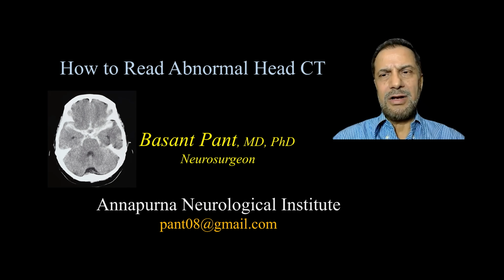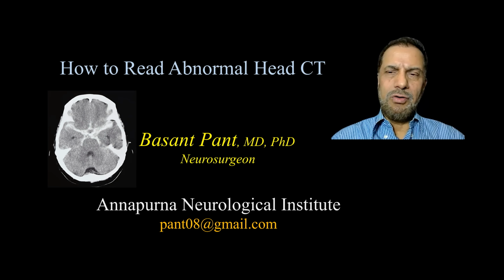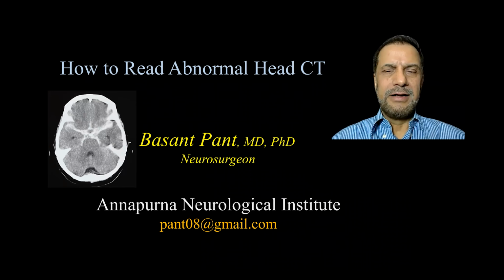In my previous video about CT scan, we talked about how to read a normal head CT scan. To go into how to read an abnormal head CT, you need to go back to my previous presentation and see how to read a normal CT scan. Only then will you understand a pathological CT scan.